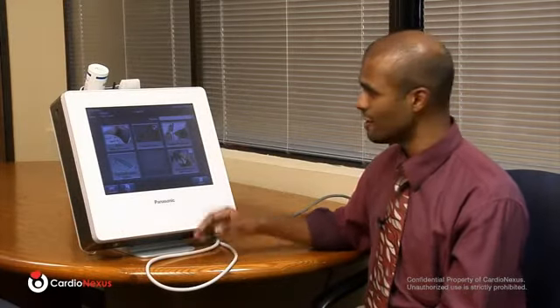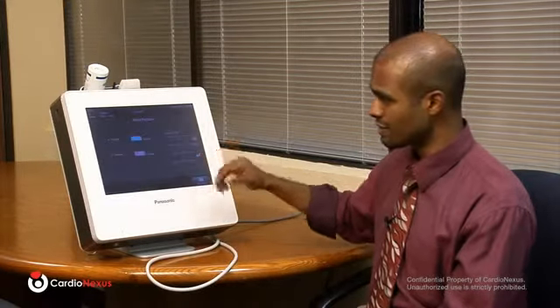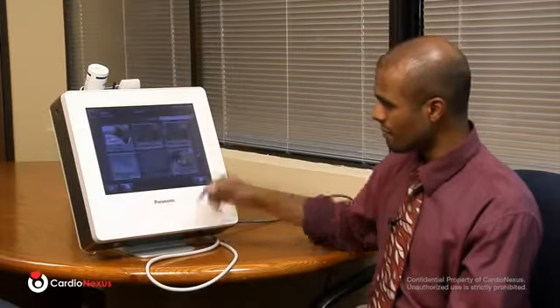Now the minimum requirements to see a report, again, since we are calculating a risk factor assessment, we do need to see the blood test numbers, total cholesterol, HDL, and LDL if you have it. We also need to know that subject's blood pressure. So simply choosing the blood pressure application and typing in both a systolic and a diastolic blood pressure. Save the data by going back to the study menu, and then again you'll notice that check mark.